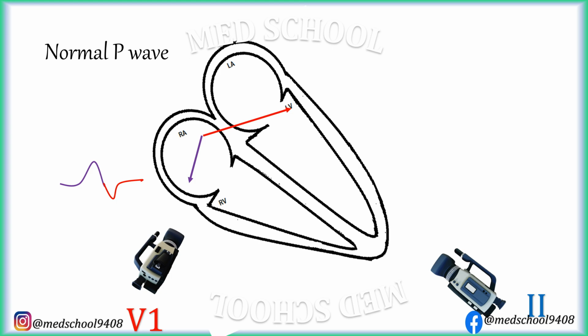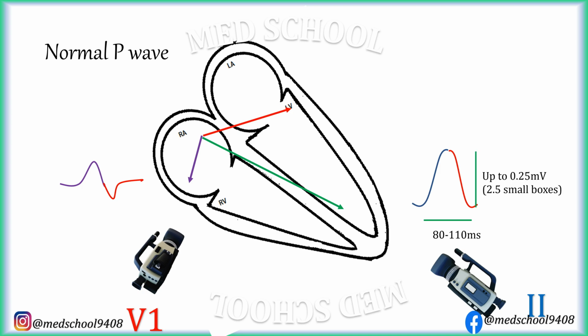Vector formed by both atrial depolarization is directed toward positive pole of lead 2. This lead shows positive P wave. Initial part of wave is formed by right atrial depolarization and terminal part is formed by left atrial depolarization. Combination of these two waves forms P wave in lead 2. Normal duration of P wave in lead 2 is 80 to 110 milliseconds and its amplitude is up to 0.25 millivolt, that is 2.5 small boxes.